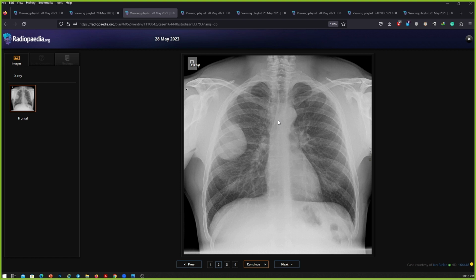There is a loss of the concavity of the left hilum. Ignore that. Why are you sure that this is a pleural-based lesion? Is there any particular reason for that? Because pleural-based lesions have an obtuse angle with the pleural line. So it appears to have an obtuse angle. It's not acute, so that's why it seems as if it is a pleural-based lesion.